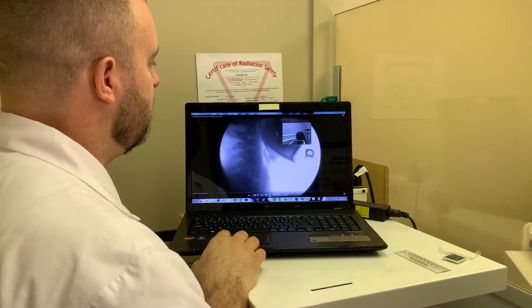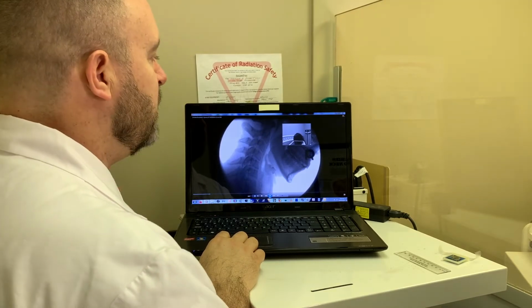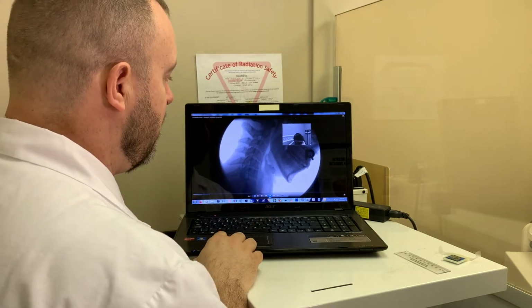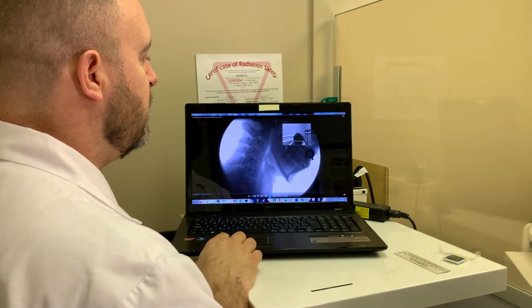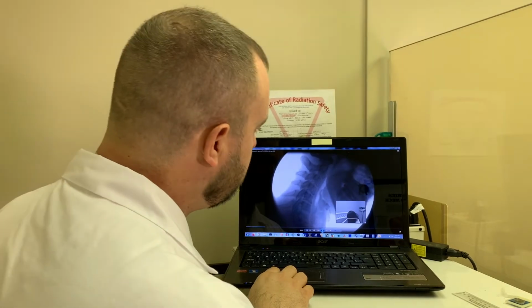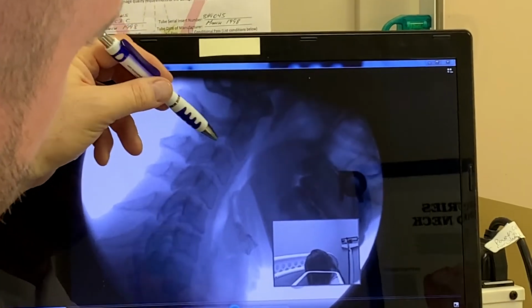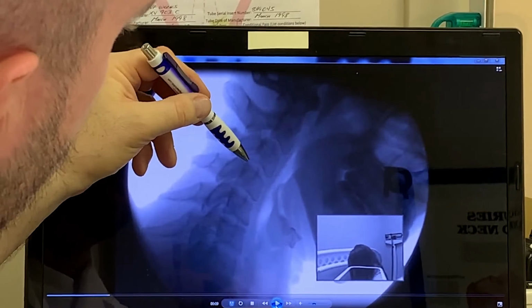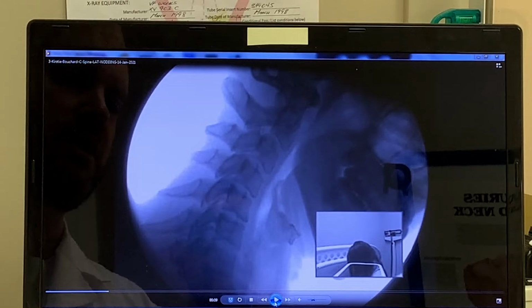And so based on the assessment of ligament integrity, the ones that shift would be suspected to have been shifting because the ligaments that would not allow them to shift that far would have been stretched. And then the other spots that aren't shifting, the integrity of their ligaments is better. So as you go forward here, then this being your second neck bone, the black line there is not aligned with this black line anymore, and then these two are subtly not aligned, and then these ones are aligned, and these ones are aligned, and these ones are aligned in this position.